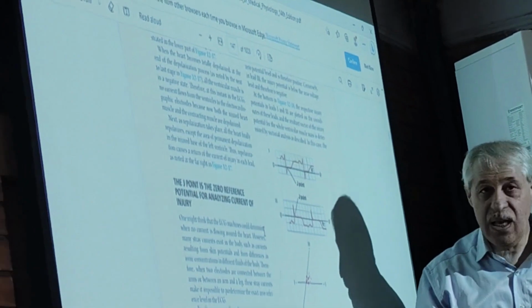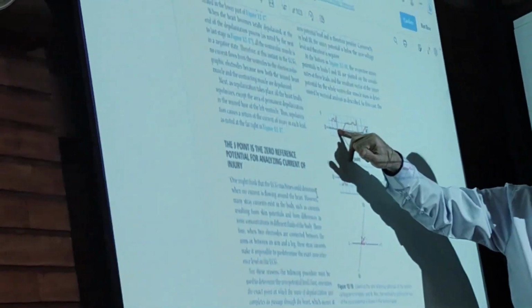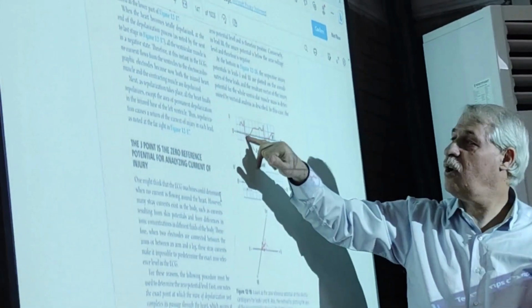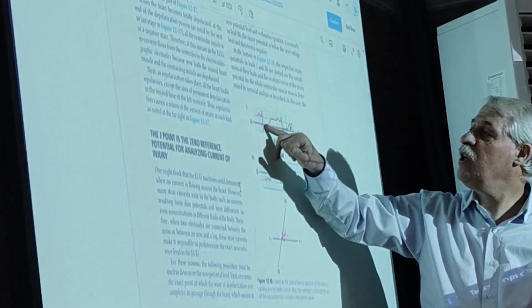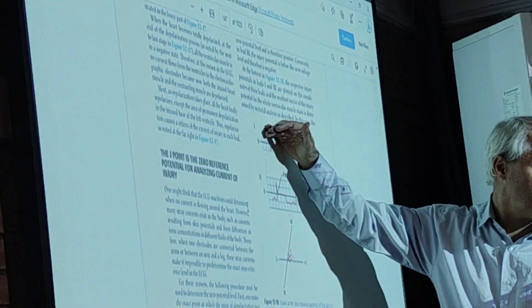Now you can make a mean vector for the depolarized area. In limb lead 1, at the end of the S wave, this is called the J point, from which you should make your straight TP line. Above it would be positive. Below it would be negative.